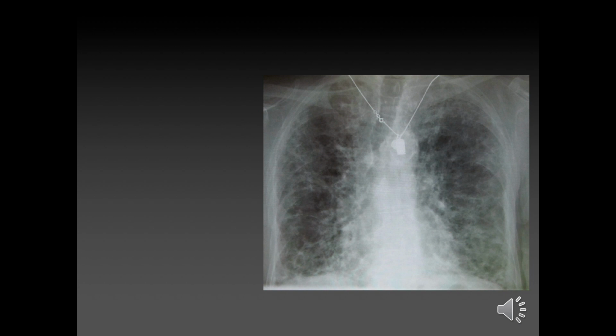Penetration looks fine. I can see the individual vertebral bodies. In terms of the edges, would you guys say that that's adequate? Yeah, so the costophrenic angle is slightly cut off. Sometimes it depends what you're looking for. In this patient, actually, you probably wouldn't mind so much, because the request form is not going to say query pneumonia. It'll say something else, which we'll come on to. But in a patient where it did say that, we might say, you know what, go back, and then we'll have a look. Fine. And looking at the airway, it looks maybe slightly deviated towards the right.